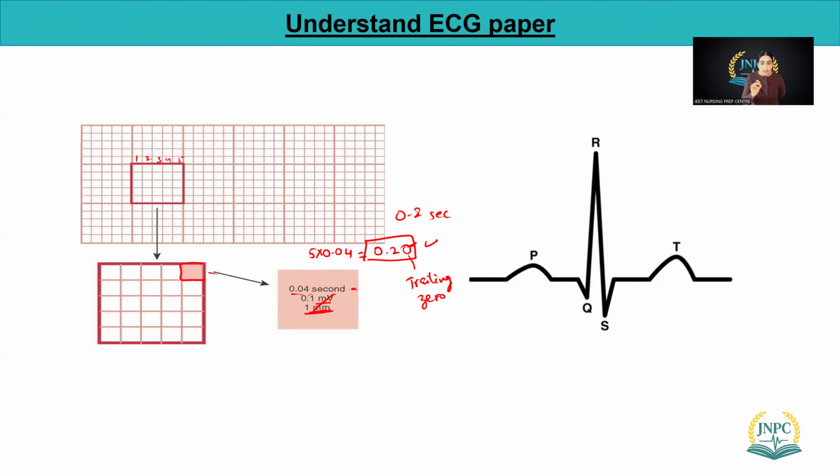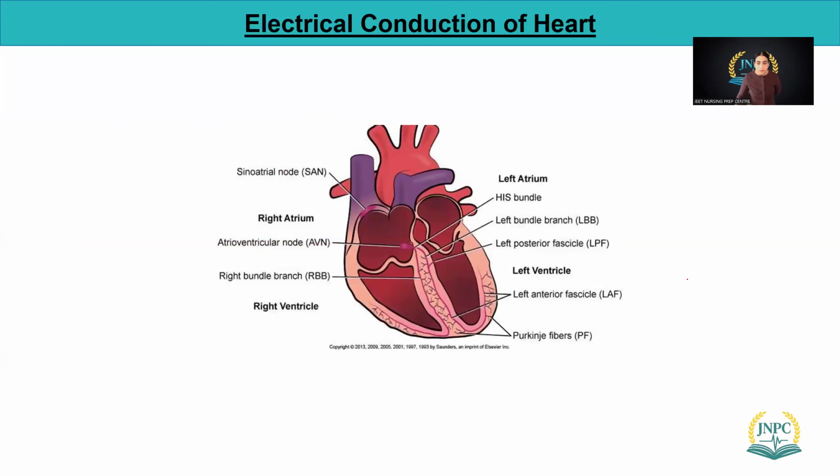We will use this later on because we have the PR interval time, we have the QRS complex, and at that time we need to know about the QT interval. What is the ST segment? Those numbers are very important and standard. I want you to pay attention because you have to memorize those numbers. There is no basic way to derive them. So that's a part where we have to pay attention, because those are things we need to memorize. So let's go to this area.